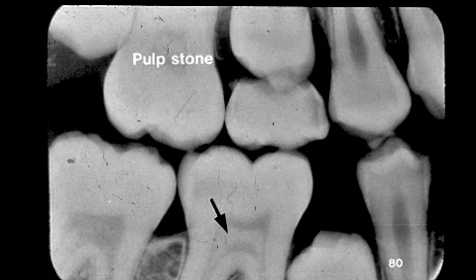The arrow for number 30 points to a pulp stone. Little problem is attached to these pulp stones unless there's going to be endodontic therapy. Above we see tooth letter A. This primary tooth has mesial interproximal caries. Would the dentist place a restoration on tooth letter A for the mesial interproximal caries?